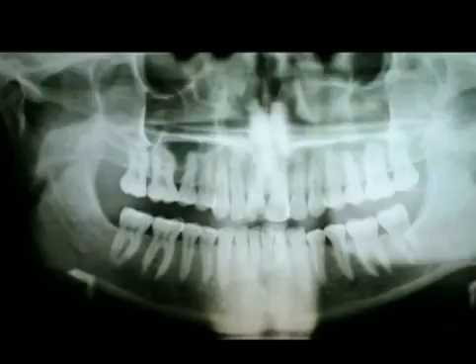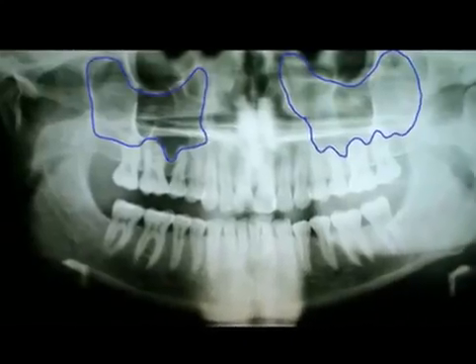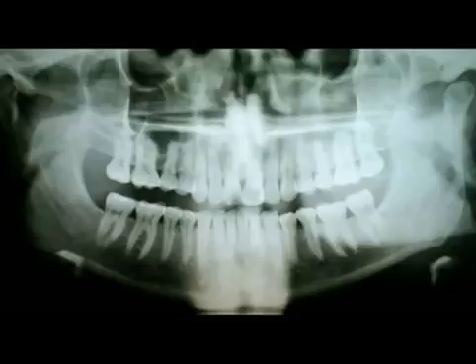The bone of the upper jaw which holds the teeth is built like the lower jaw. It borders on the maxillary sinuses, which border on the eye sockets. Since there is less bone here, the maxillary sinus is usually filled with air, and the eye is filled with liquid. These areas are also dark. Every once in a while you can make out white lines, which are projections of the cheekbones. The cranium is shown spread out. It is also easy to recognize the nasal cavity and the nasal septum.